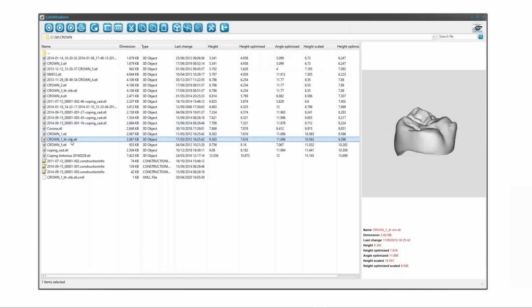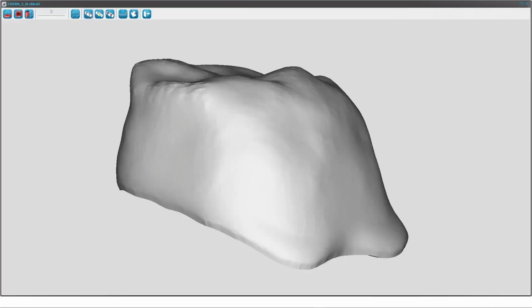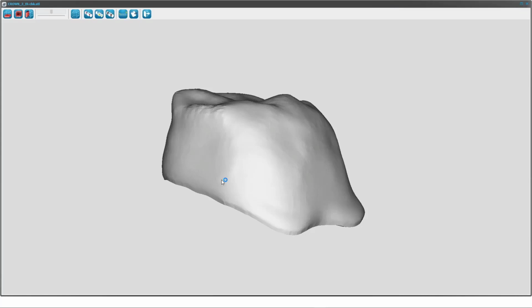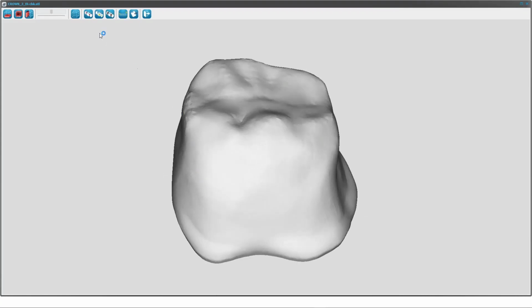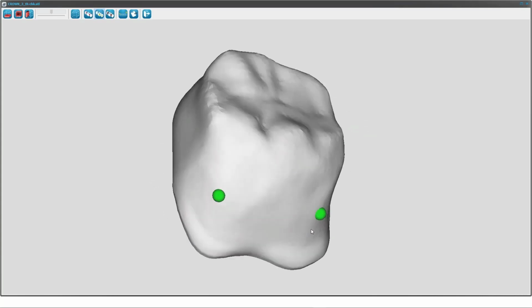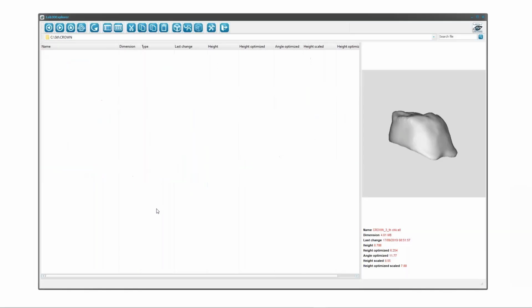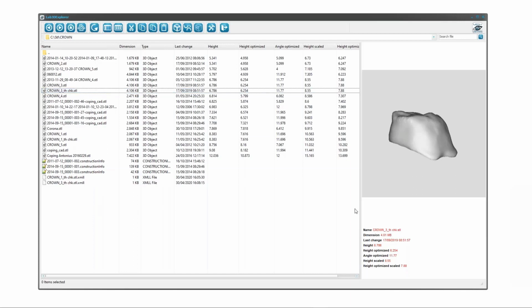Also, another interesting thing is this. For example, let me open this one. Before, I told you that it's possible to say where you don't want to place any pin, or reverse, you can say, for example, I want to place connectors here and here, in a sort of strategic positions. Now there's another interesting thing that I didn't mention.